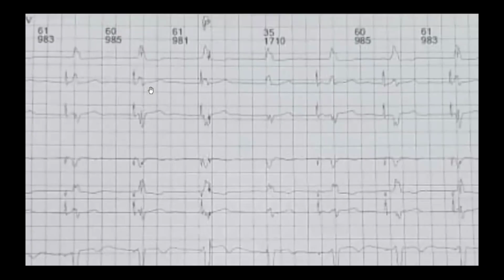No, unfortunately. But we can notice here a ventricular safety pacing also. Ventricular safety pacing here and atrial pacing here. Here, no atrial pacing as this is considered a PVC. The junction is considered a PVC, which resets timing. Here there may be conducted atrial pacing and resensing.